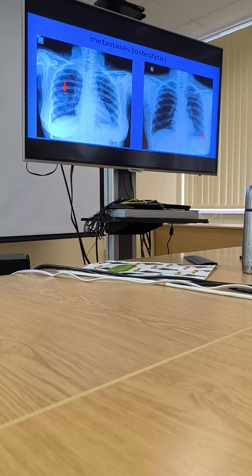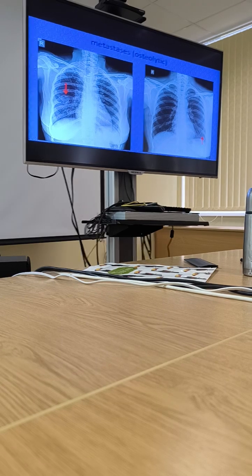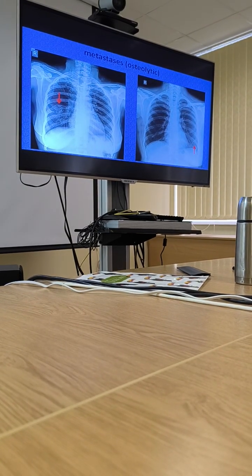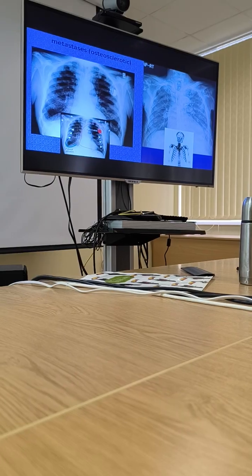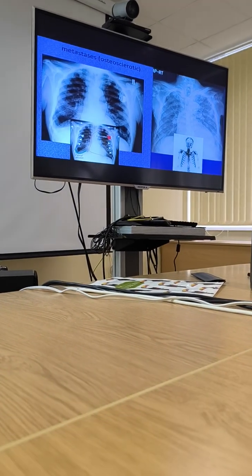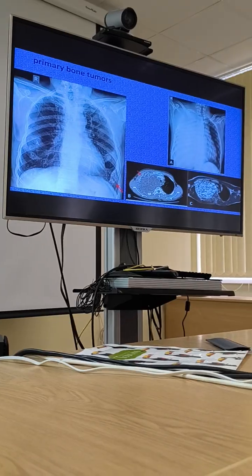It's typical for breast cancer to produce osteolytic metastases, and they are more or less clearly seen on other pictures. Another type of metastasis is what we name osteosclerotic, and that means that they are dense, they have bone material in them. And there are bone tumors, the chest wall bone tumors.